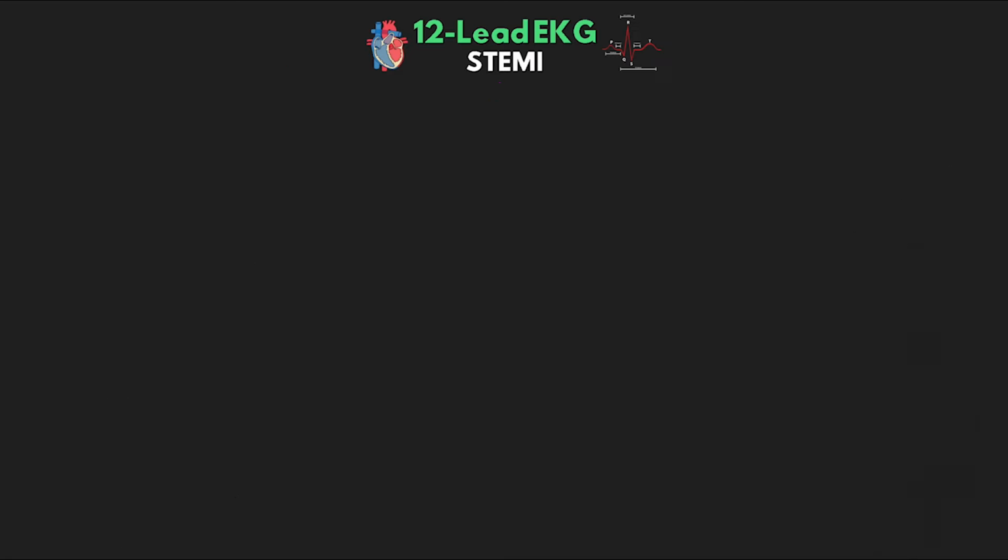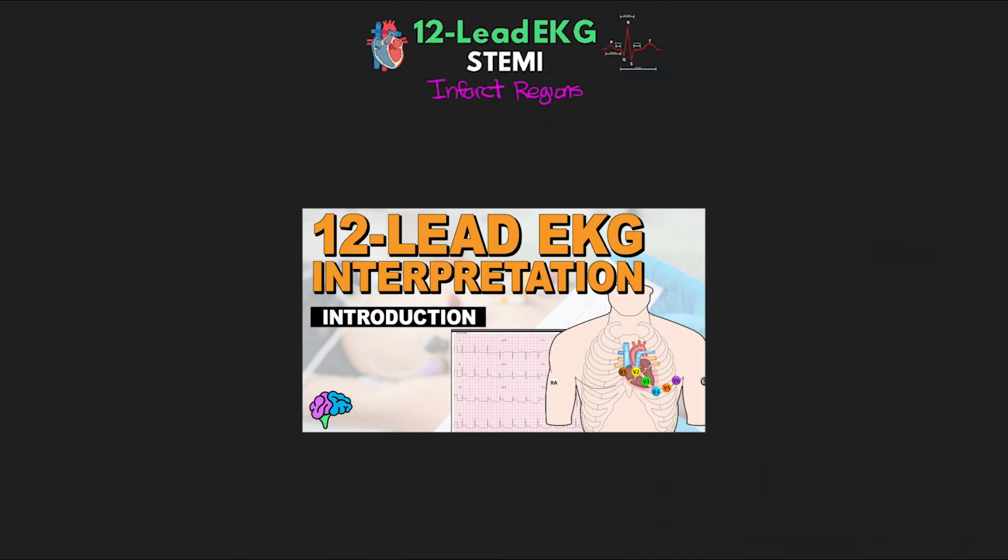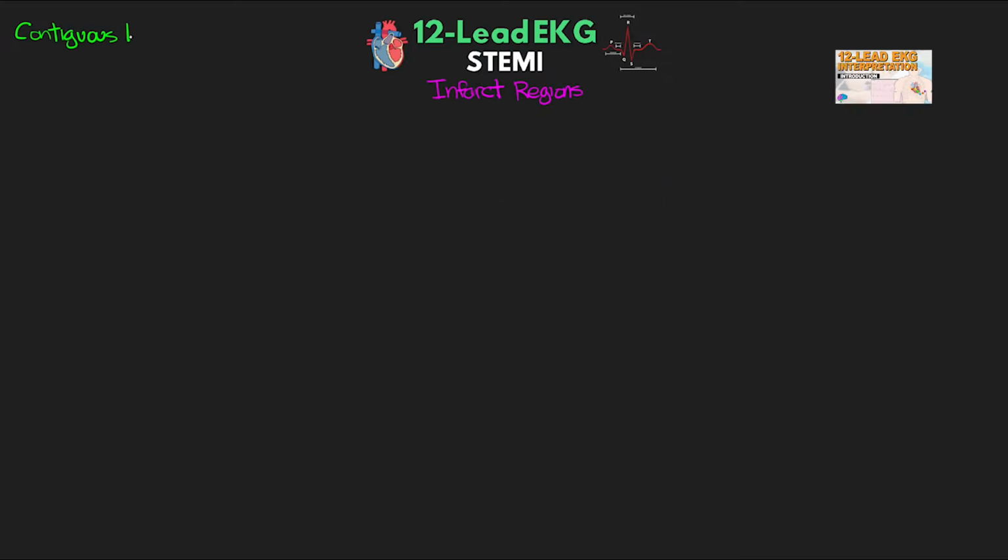Now that we have that out of the way, let's talk about the impact from all of this that we see on our 12-lead EKG. To start the discussion off, we need to revisit a topic we covered in one of the very early lessons in which we talked about contiguous leads.